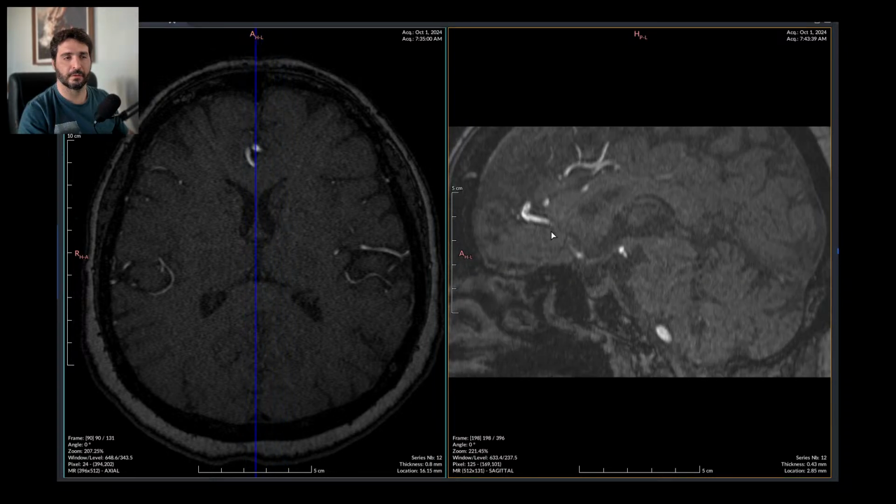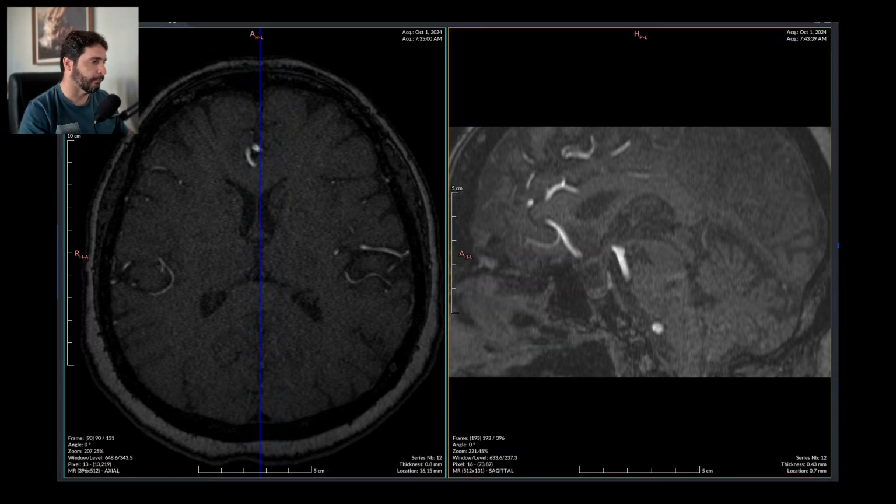So the pericallosal artery is fine. Oh, she is 51. Yeah. I wouldn't be worried that much about bladder cancer still. Urinary infection and urinary stones too. Oh, so it's gone. It seems cured.